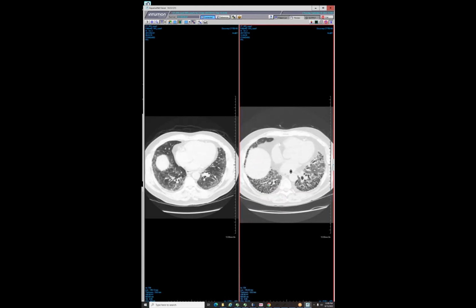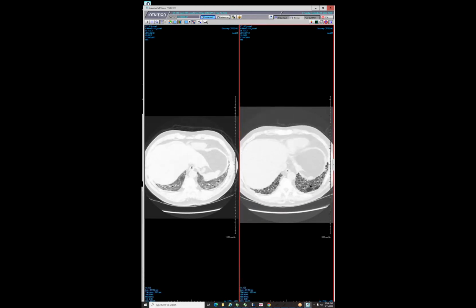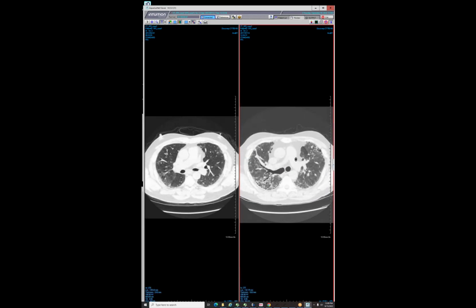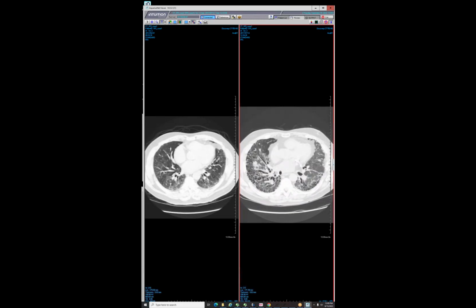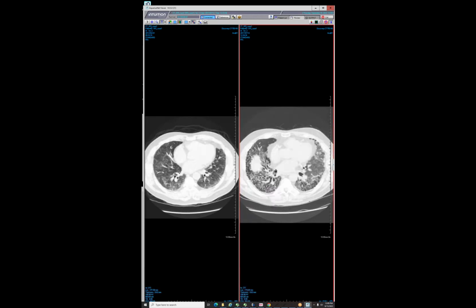And then I always harp about this, where you have a case where, of course, the one on the right is going to be UIP, but with the new terminology, we have to say findings inconsistent with UIP because of the amount of ground glass, and this is clearly due to connective tissue disease. But at the same time, it is UIP. I just run circles around in my mind on it.